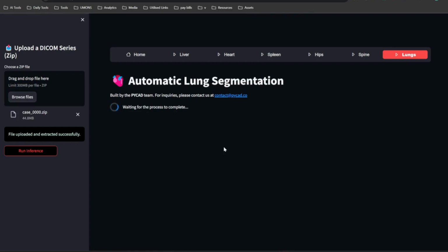So imagine if we deploy this application on better hardware. When I tested it on my local machine, for example, I have an RTX 3080 with 6 GB of GPU memory, which is not the best GPU we can get, it's just a laptop. On that one, it takes less than 20 seconds to complete the whole inference for the whole CT scan. Even for a large CT scan, it doesn't take a lot of time.